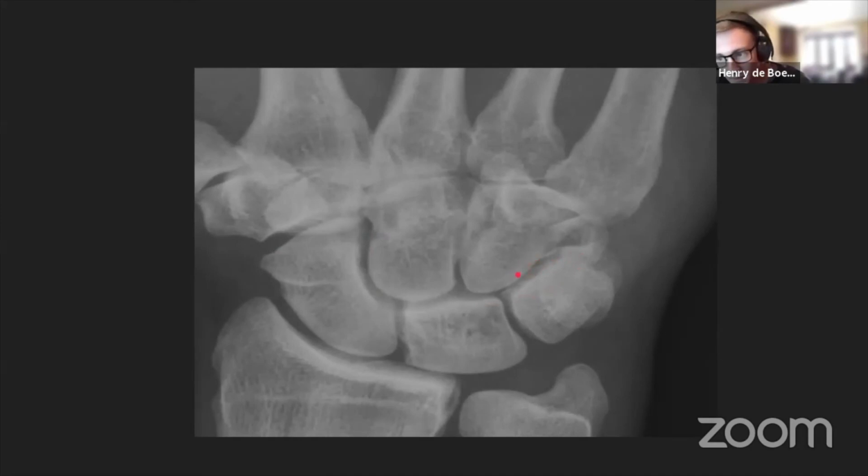What we've got here, this one is quite an old radiograph. This one wasn't a current case, which I think is why people are thinking it looks a bit sclerotic. These bones, I think it's just the way the film's taken. There isn't really much degenerative change or OA, and these bones are probably normal density. It's just an old film, which was given to me.